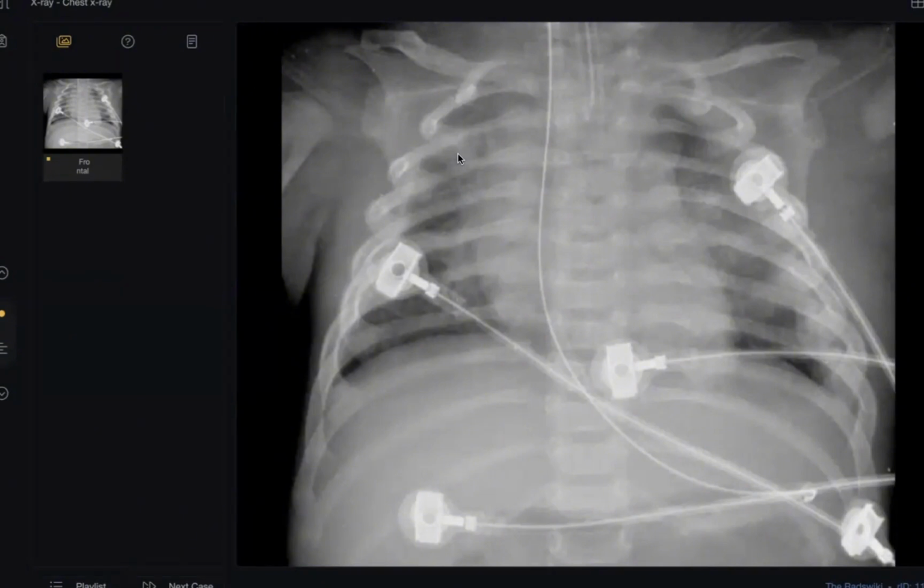Why? Because we are in a sequence of pediatric anomalies, and I put this case as a tricky case. But I think she looked at it well. Okay, go on, doctor.